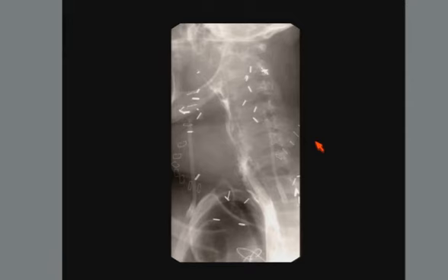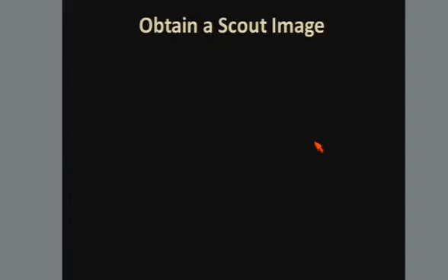The surgeon takes a flap of skin from the forearm with the radial artery and draining vein and makes a neopharynx that's anastomosed near the base of the tongue and up in the cervical esophagus. So these are the areas where it will leak. It can also leak anywhere along the anterior portion because this is where the sutures are to make the neotube.